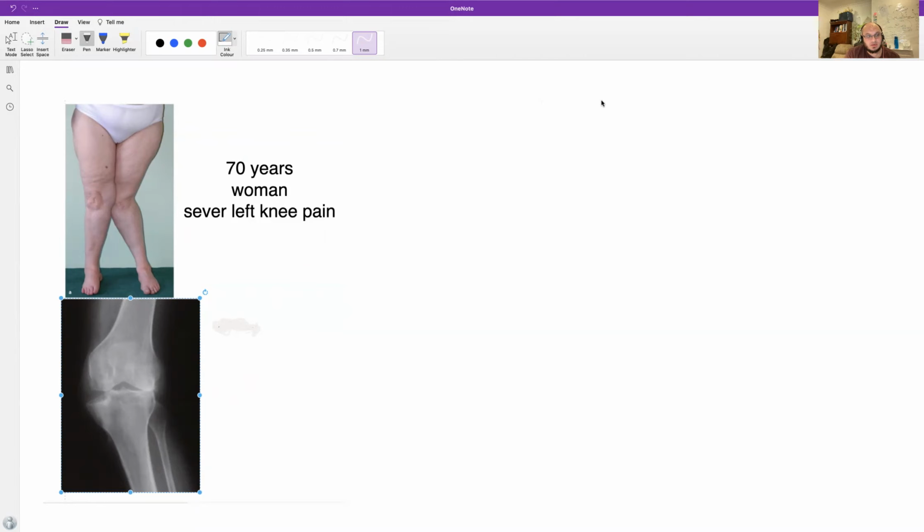This is a clinical photograph and a plain radiograph of the left knee showing severe valgus osteoarthritis. There is a severe valgus malalignment on the clinical photograph. The plain radiograph is an AP view, not annotated as weight bearing or not, showing medial joint space opening, lateral joint space narrowing with subchondral sclerosis. This is a severe degree of valgus osteoarthritis.